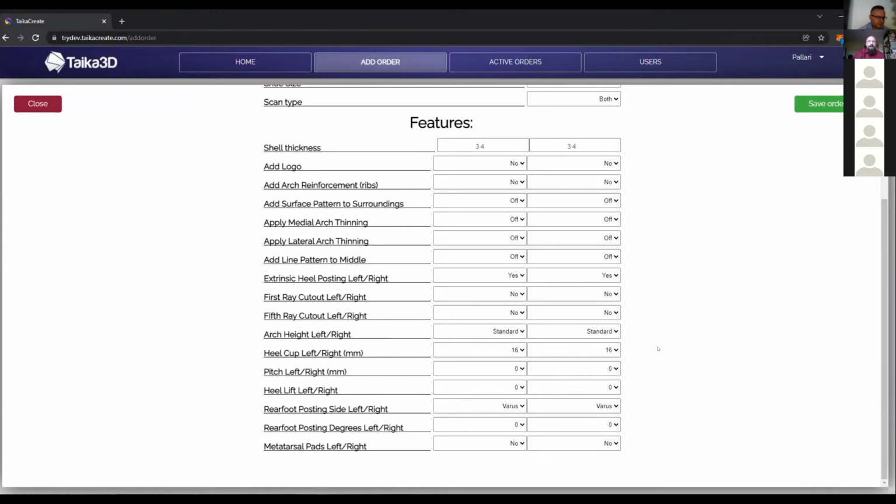This is not a generic design tool that you can use to make 10 different medical devices, ankle braces, or prosthetic sockets, like Inventor or Blender. Those would be what I would call generic design tools. This is set up for this particular company and for this particular product, and that's the strength and the limitation of that system.